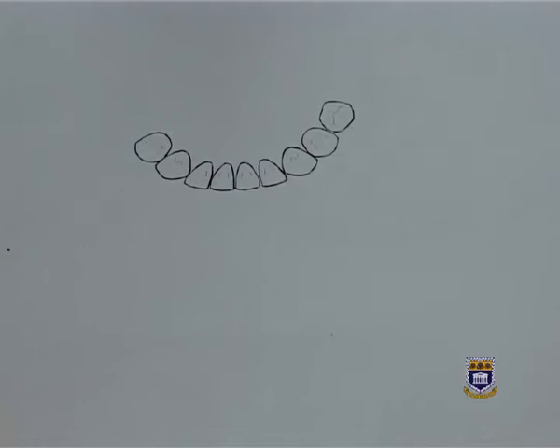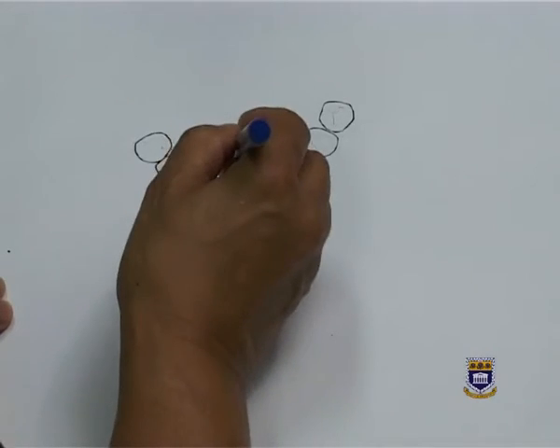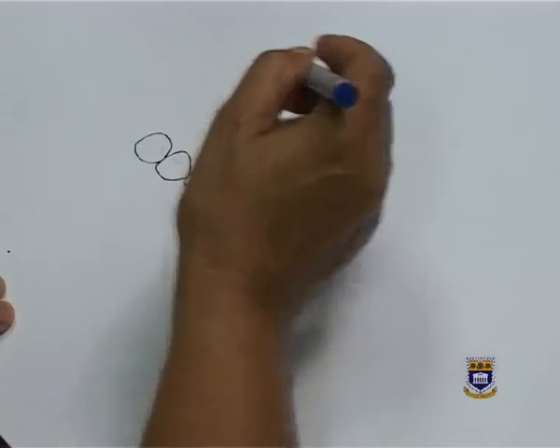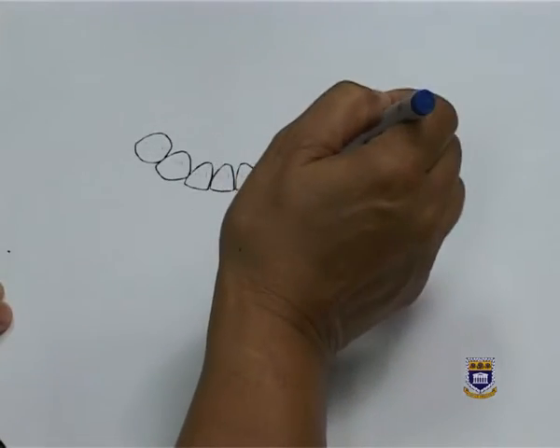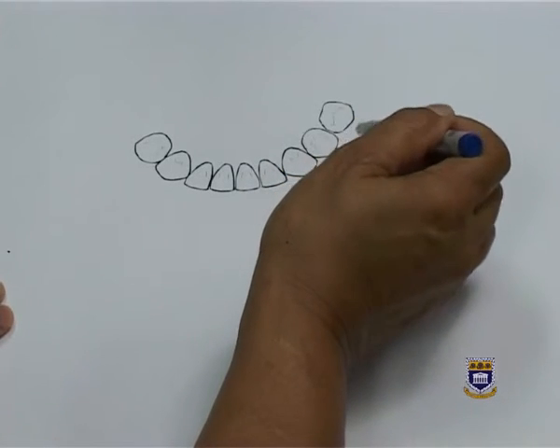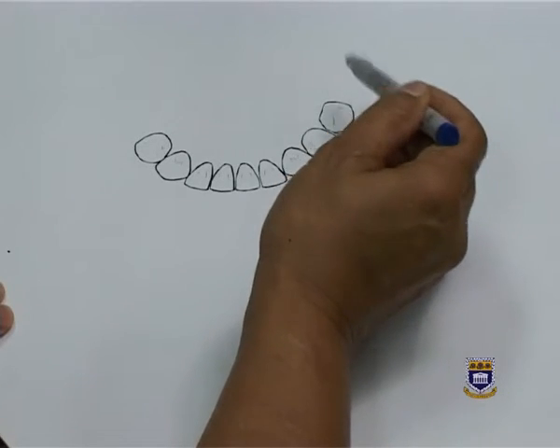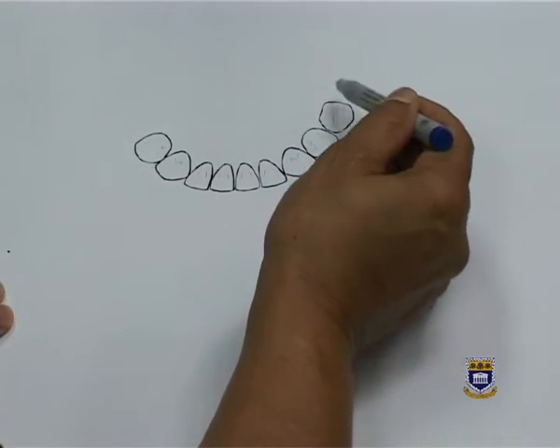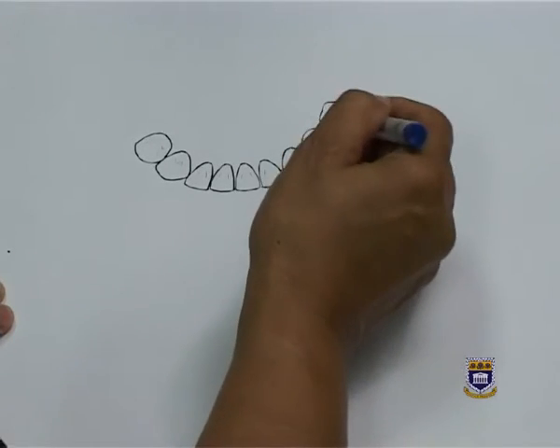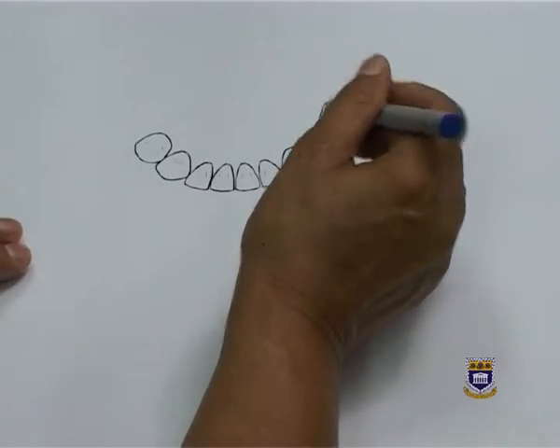So I will be designing a metal partial denture, and in this case I will be designing a lingual bar. I have surveyed my models. I'm going to choose an RPI system because the RPI system has been designed to protect the abutment teeth. So in the event of torquing or rotational movements, the RPI system will protect the tooth and will then prevent the mobility of the tooth and maintain or retain the tooth in the patient's mouth.